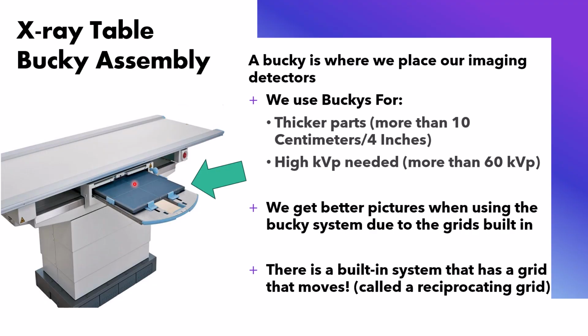The Bucky is where, if you were using film, because these are made where you could actually use a film. Most of them, if they have a Bucky like this, you could use the film, you could use a CR plate, or you can use a DR plate. It's where you're going to place the image receptor.